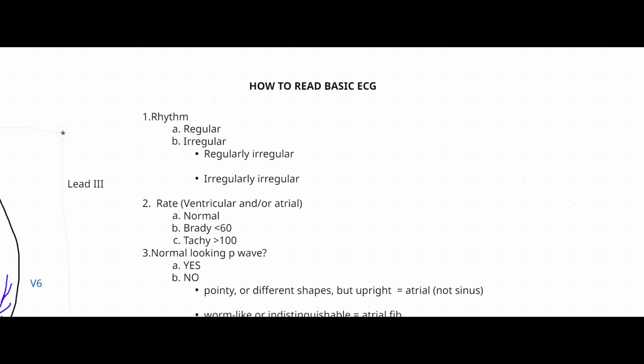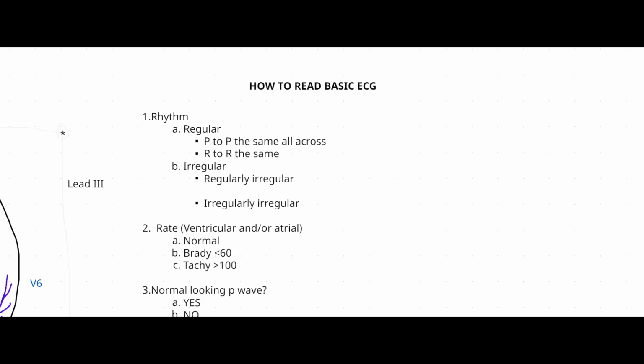So regular, so we'll put as far as the P to P, P to P is the same all across the EKG, or the R to R, this is the same. Okay, so how does that look like?